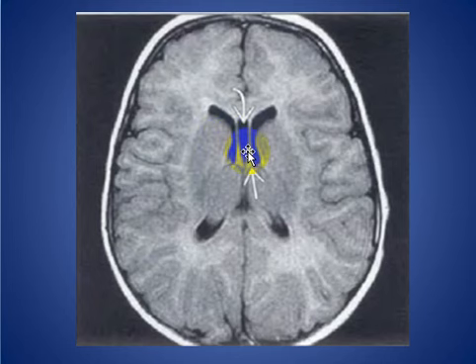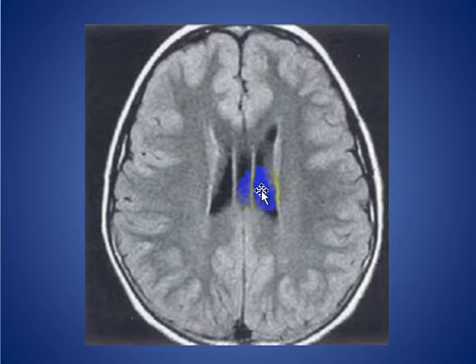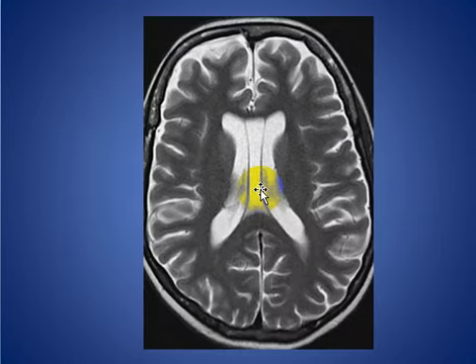Another patient with cavum septum pellucidum, as we see a drop-shaped thickening of the posterior aspect of the fornices here, and this is parallel to the frontal horns. Here is the same patient previously with cavum Vergae. It is parallel and bowed to the lateral ventricles.